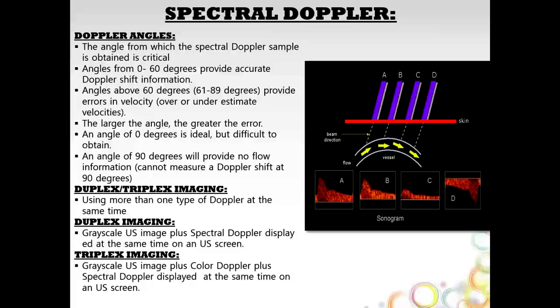Doppler angles. So these are really important when we turn on color Doppler. When we turn color Doppler on, first we get our color map that comes up, our color box, and that lets us have color flow within the vessel. So we'll say this is our vessel here. We're also going to get a line, and there's a little sample volume attached to that line, but we're also going to get an angle, and we want our angle that comes up to match the direction of our flow. So here's our angle signal that's going to come up.